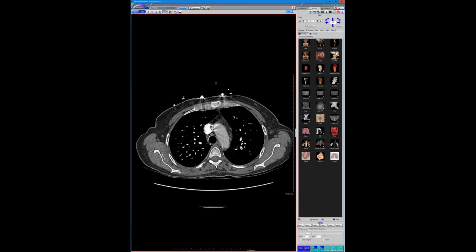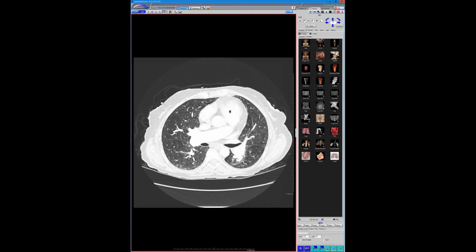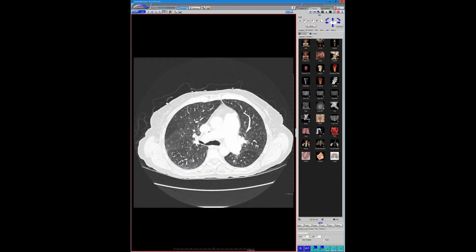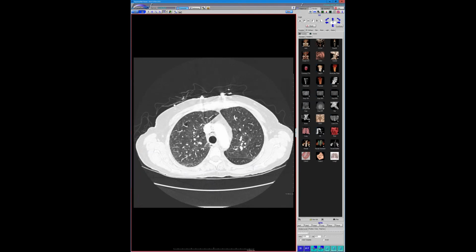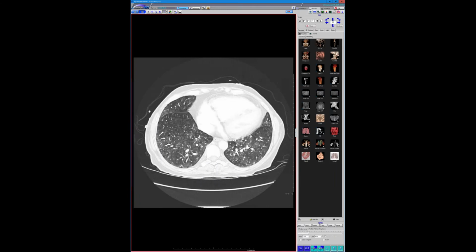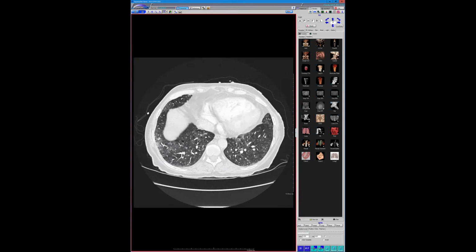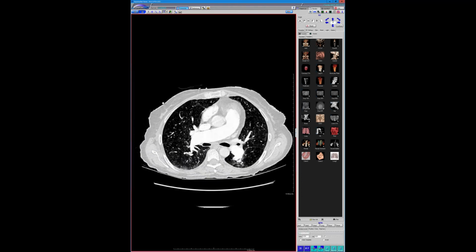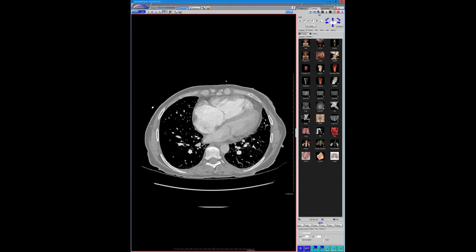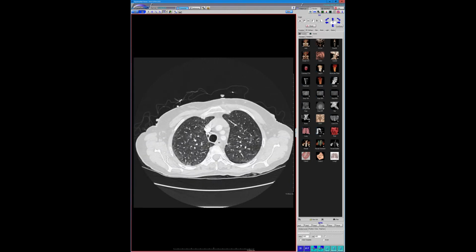No clear lesions elsewhere, but she has raging pulmonary hypertension, those nice kind of what I call perivascular blushing, some small cysts, which, not really specific. There's a couple of them. Those can be seen with neurofibromatosis. So theoretically, but it is a rare cause of, there is a known association between NF1 and pulmonary arterial hypertension. That's been reported to occur in a higher percentage of individuals than the general population by a significant margin, although it's still relatively not super common.